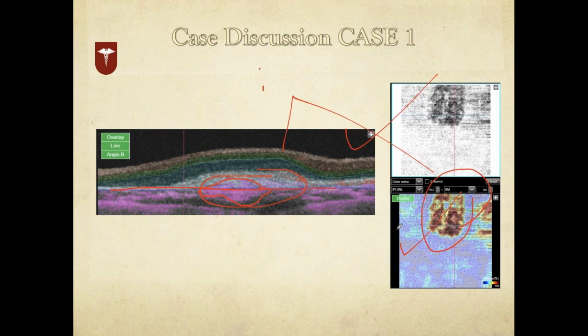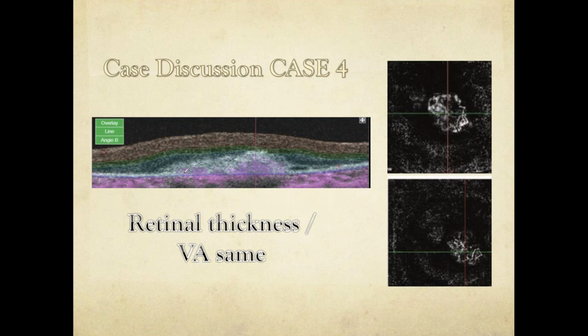Fine? Because as long as this is there and you don't provide anti-VEGFs, the patient will return back to you with hemorrhage. Now, the same patient was treated with Avastin even after attaining a flat retina. Most of the people would say, what are you doing? The retina is already flat. The vision is already 6 by 36, right? Let's say the vision is already 6 by 36. The retina is already flat.